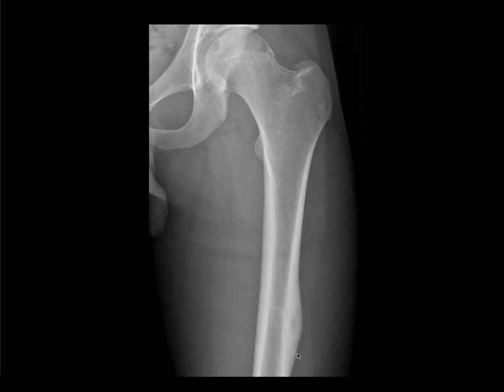Usually it has a pattern like this. If the nidus, the center of the osteoid osteoma, is actually in the periosteum, just on the very edge, you can get a very aggressive looking periosteal reaction. But usually you get this mature pattern and recurring pain, often, as you possibly know, relieved by aspirin. That's the classic description, and occurring at night.